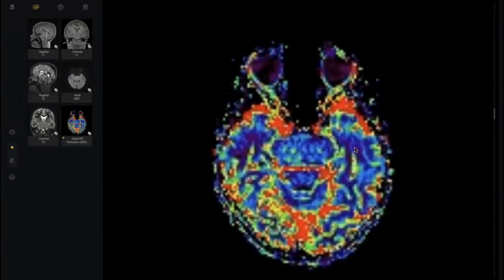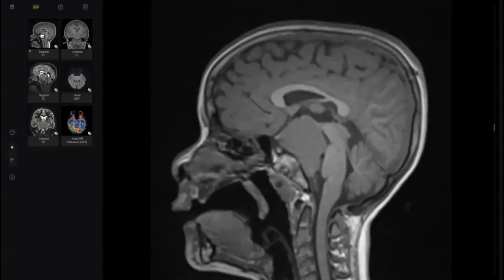Brain parenchyma. Excellent. So this could be something like a hamartoma, a gray matter abnormality in an abnormal location. So the most probable diagnosis here, tell me. Could be heterotopia? No, heterotopia is something inside the brain itself. So it would be a hypothalamic hamartoma. Excellent.